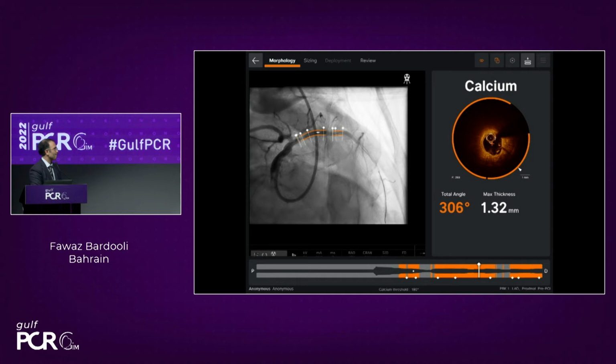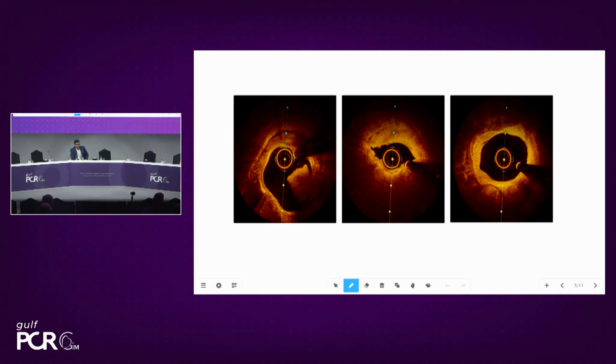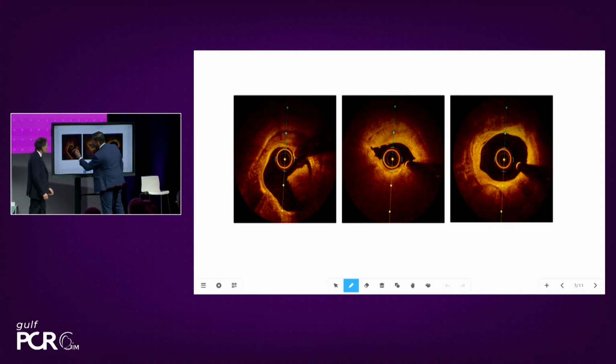Thank you. You are talking about a deep calcification. This is thrombus. We are not sure, based upon the days we were living, yesterday and today, that everybody understands exactly which is which and how to react. Here, number one, you have the same pictures that we selected at 3 different steps. So, Mahmoud, do you want to show something?